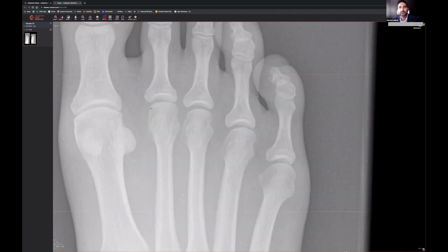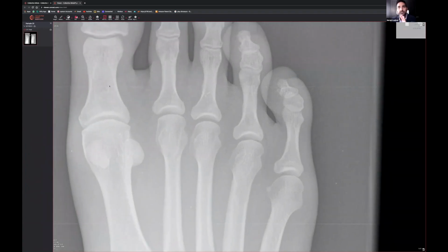Next thing to do is to have a look at the metatarsal heads, because sometimes what can happen is that you can get some kind of avascular necrosis, I guess, of the metatarsal heads, basically flattening of the metatarsal heads. And that is known as Freiberg's infraction. I think they used to say, or they say it happens as a marching injury. People who march a lot, I don't know why, but they would have increased pressure in these particular areas over here, and they can end up getting sort of flattening avascular necrosis of those areas. That's not the case here. We don't have that.